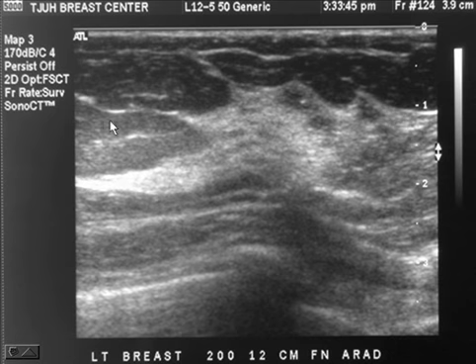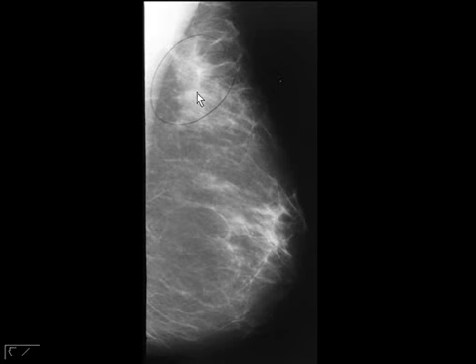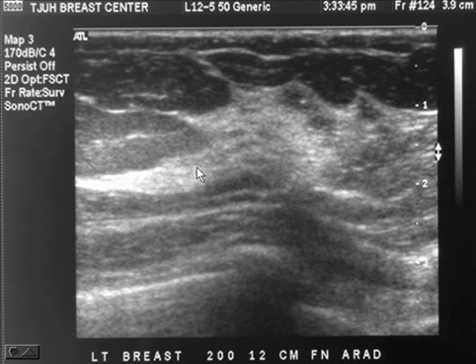And it was. So now you can use ultrasound to not only tell you that, yes, this corresponds to an abnormal mass, but to reassure you that this region corresponds to normal breast tissue. But of course, when you're using multiple modality imaging, you're using a mammogram and an ultrasound, or an MRI and a mammogram and an ultrasound, you have to kind of look back to the modality that was the most suspicious. In this case, this was not suspicious. We don't see anything here. We just see normal breast tissue.